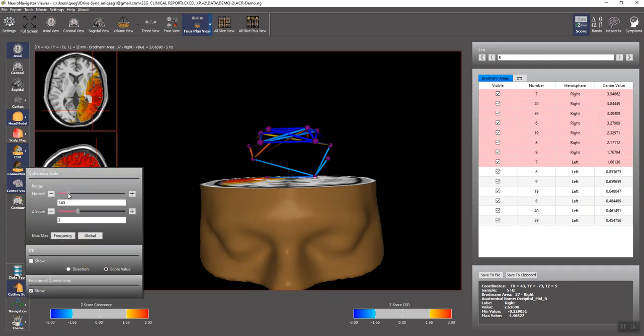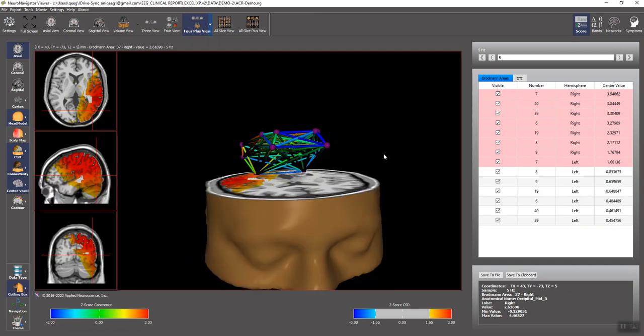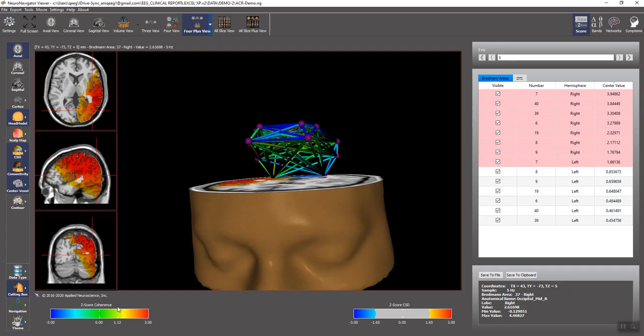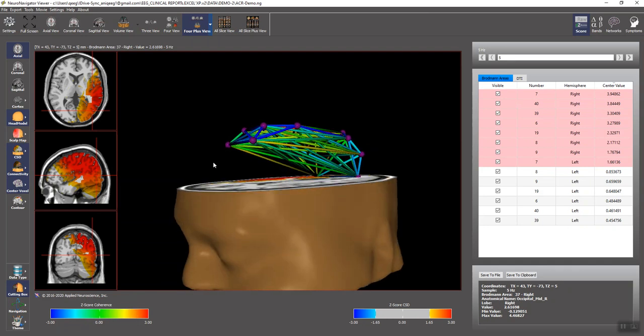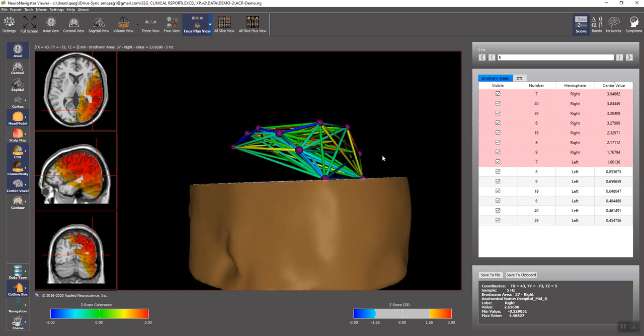set the Z, it goes by default to 1.65 to 3, but I want to be able to show all of the hubs and connections. The Z-scores in the lower left here, the green is within the normal range, and the yellow, etc. As you move your mouse, you can see the magnitude of the Z-score deviations that are there. And so this is how we assess this network.